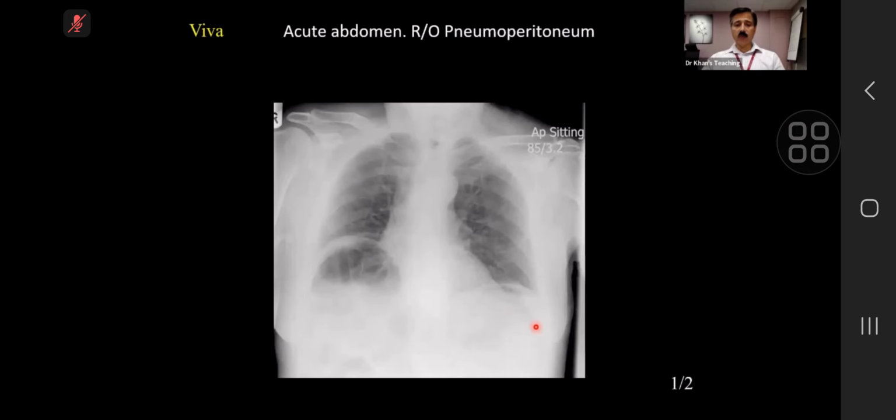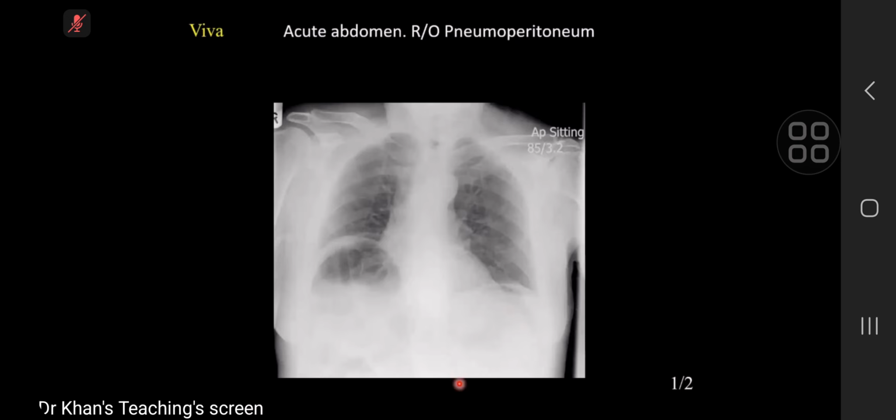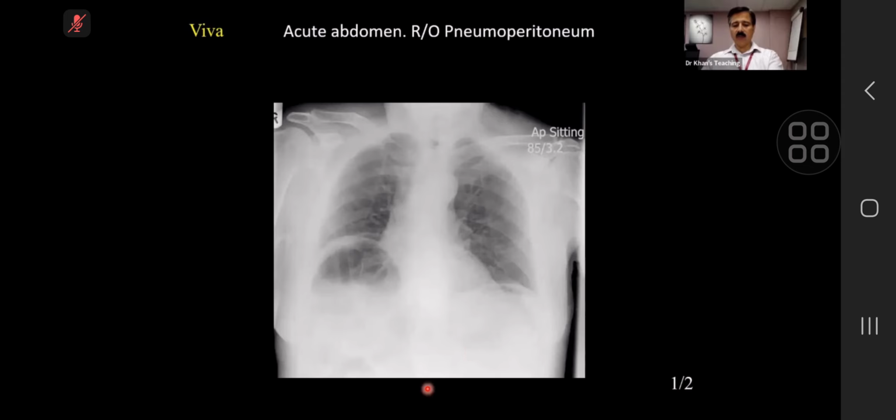Acute abdomen, pneumoperitoneum, yes or no? No. So what is it? Chilaiditi syndrome, where you have a part of the hepatic flexure projected over the liver. Okay, that's fine. Now, this film can be shown to you even in rapid reporting, just to confuse you, where some people might pick it up as pneumoperitoneum. This is what we call interposition of large bowel in between the diaphragm and the liver. And the key thing is that the haustra will be projecting in.